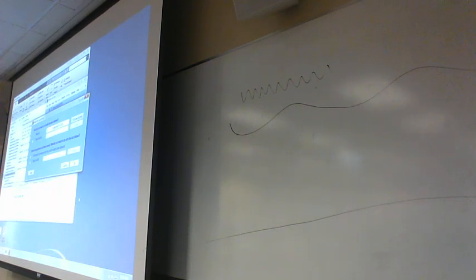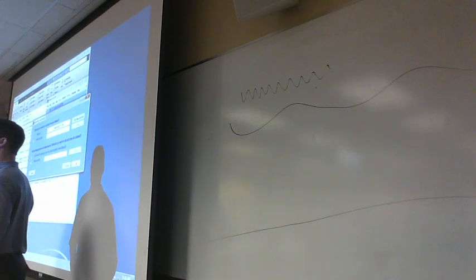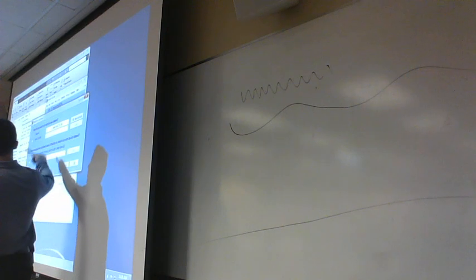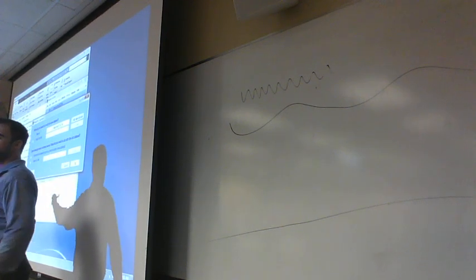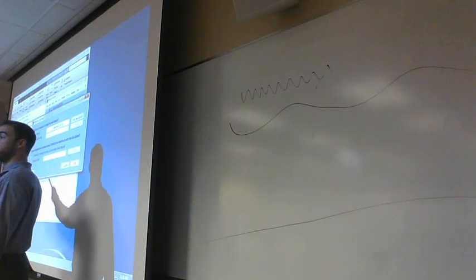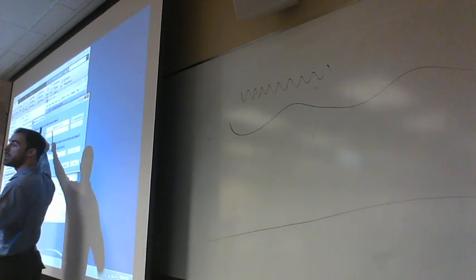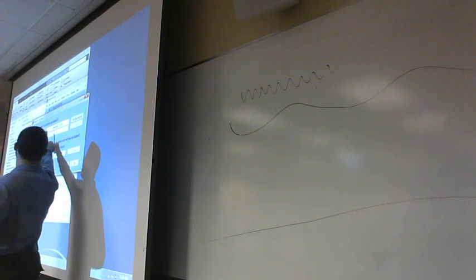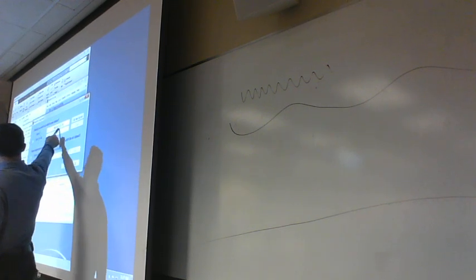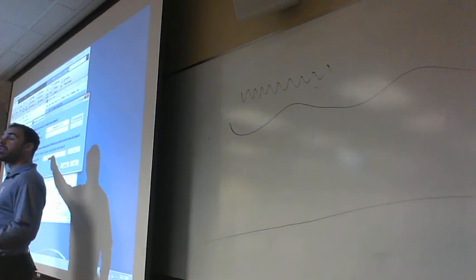Okay, so it's done with that. It asks us what we want to do with the data set. So we want to have a little chat with the computer and answer its question. Guys, pay attention. This is our data set, and it added something at the end of it: filter. So now we know that it was filtered.